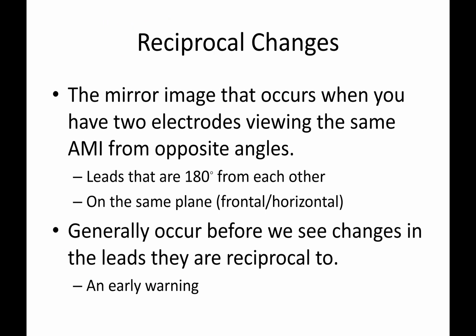Reciprocals. So this part's a bit challenging. I wish this had been better explained to me early on looking at these 12 leads. So I'm going to do my best to try and make sense out of it for you guys so that when I make reference to it, you can kind of put it all together.